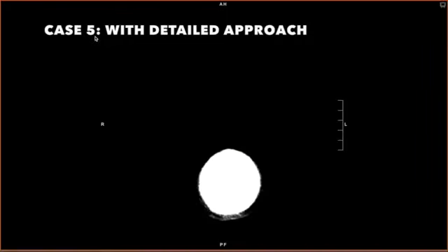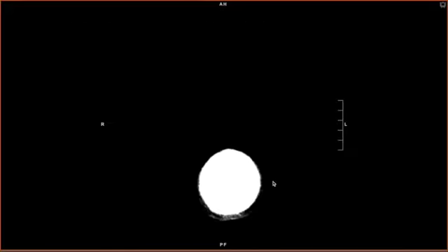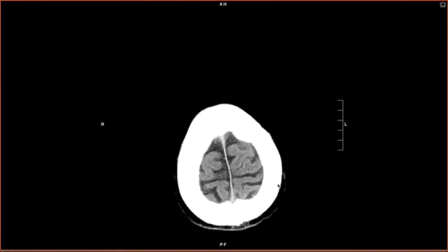Okay, for the future radiology residents and the radiology residents out there, let's go through a more complete approach that's a little bit more detailed and looking for more subtle findings. This is a subtle case. This is a patient who came in with a trauma. So again, similar principles to what we talked about in our conceptual approach.